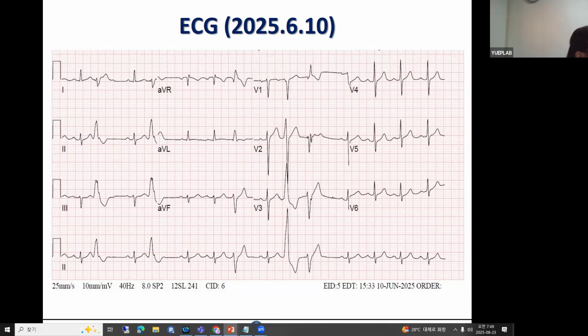I think they're most similar in QRS morphology compared to the previous frequent PVC ECG. It looks like the right precordial lead is... yes. PVC, and lead 2 became taller, and the intrinsic deflection time of V2 is longer. Right. So I guess this PVC is coming from the left coronary cusp area or the LV summit area.